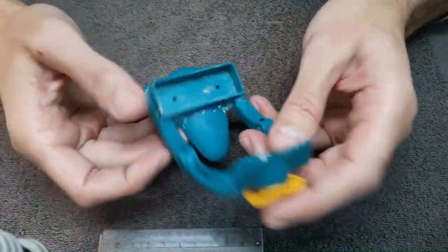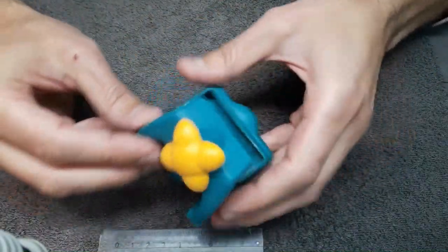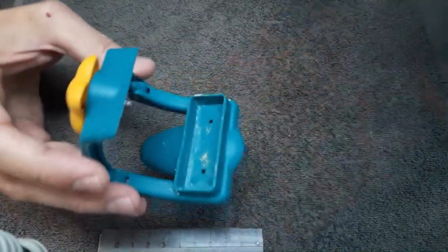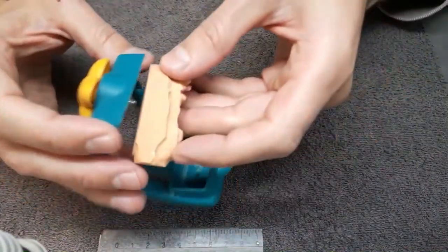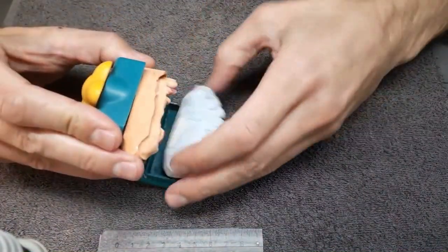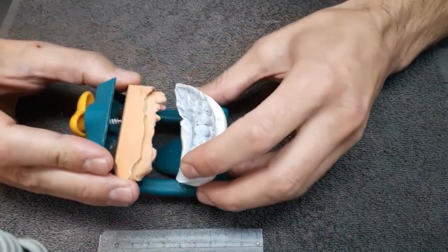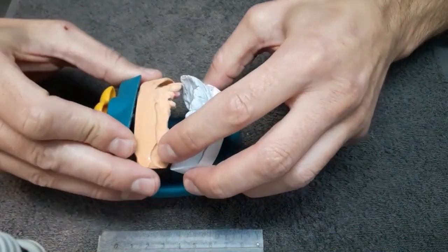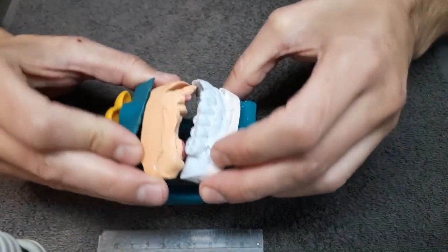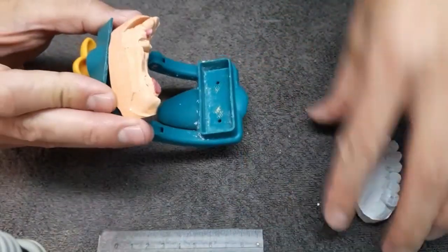And this is another type of articulator, for half arch. And you see the two arches will sit in position. You can imagine how this would work. So this is not very precise, but sometimes for fast working, for single teeth, they can be used.